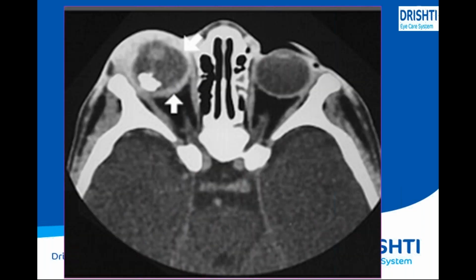So in this eye, if you see, this is a regular eyeball, but here the white intense area is similar to your bone. So you can compare how hard the mass is. If the intensity of the mass is like this, it means this is a regular solid mass. If it is a black one, that will be a cystic mass. If it is compared to the bone, and it is enhanced like this, it means this is a very hard mass, a hard calcified mass. So this is the case of retinoblastoma.